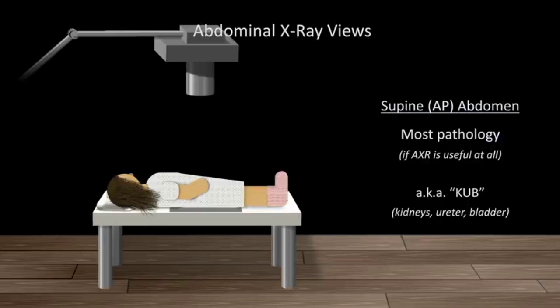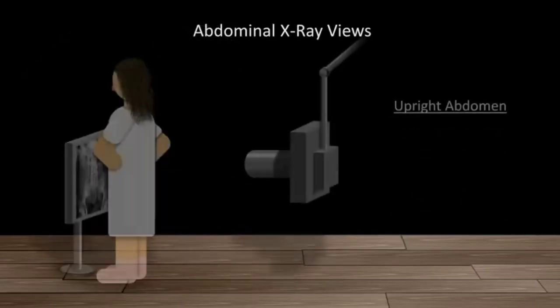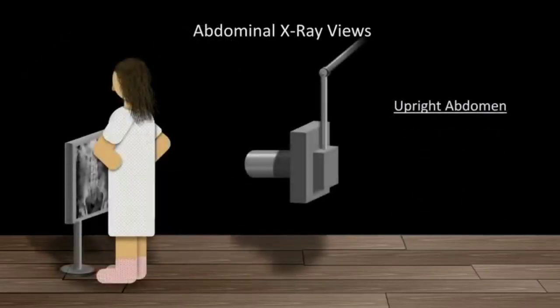So this is the liver in the right upper quadrant. This is the right kidney over here. And the reason why we can see the outlines of these organs relatively well is because there is fat in between them, and that fat is slightly less dense. This here is called the properitoneal fat stripe. Don't worry what it is. The principle here is the fat is slightly less dense than the soft tissues. Okay, so now that we know the very basics, let's move on to interpreting abdominal x-rays.